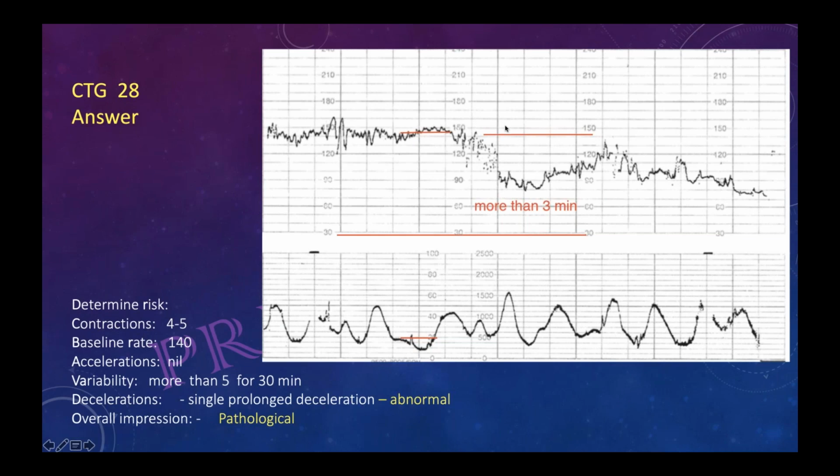And usually when this type of CTG comes, you will find only one big prolonged deceleration. If it is a late deceleration, there will be many of the same kind, so you will get a bigger trace. That issue will not happen in the exam. Now you can easily make out what we were discussing, late deceleration. That was not this kind. This is very clear. When this kind of deceleration comes, it will be only one in your trace.